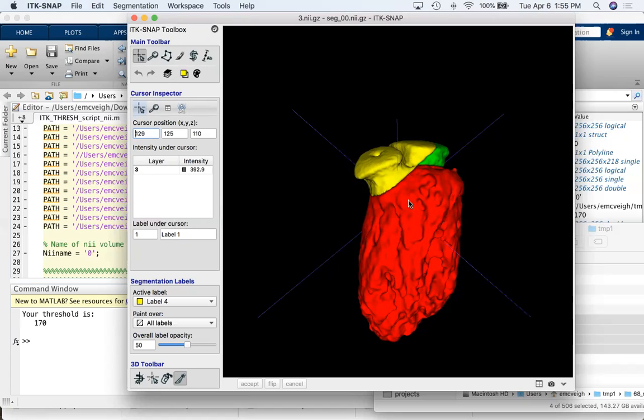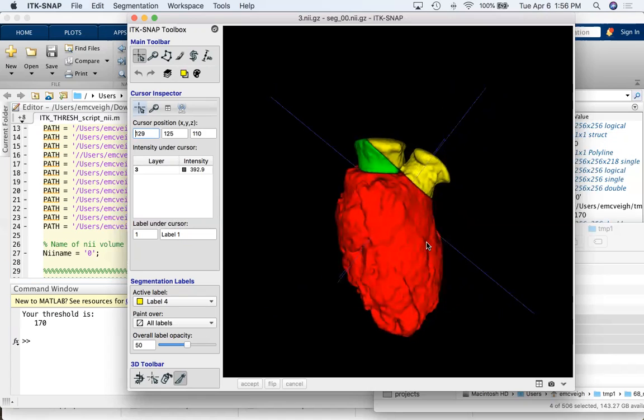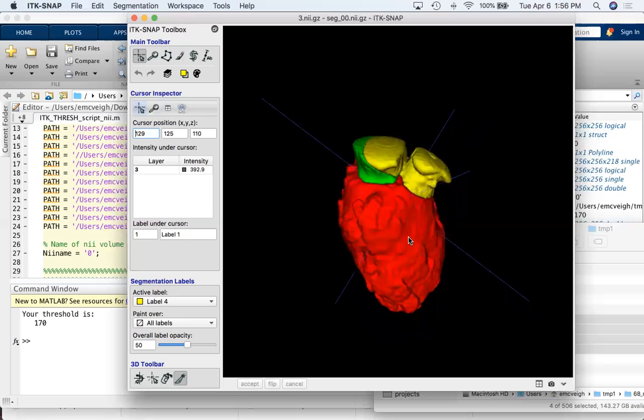I think this is much faster than the way you watch the videos on how to do this. The way people have been doing it is every frame they stop and do this process before they save the segmentation. I think it's better to do one type of segmentation back to back to back and go faster.